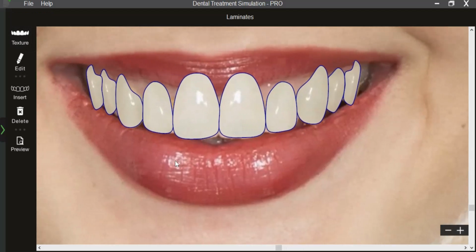This fills a default texture to the templates and helps visualize the designs better. As we can see, the mesial margin of the second premolar is visible above the distal of the first premolar. To correct that, start clicking from the distalmost tooth and go on clicking mesially till the midline. Repeat the same on the other side.